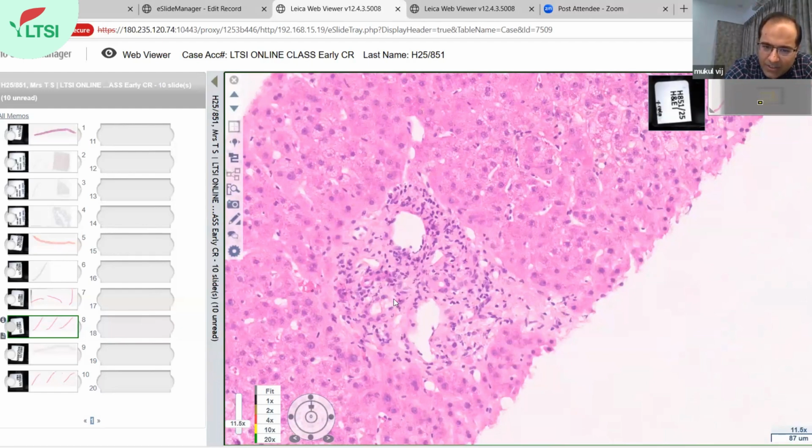This is the bile duct here, but there is definitely some injury in the biopsy. Not much inflammation. Still, you can see a nucleus loss here. This ductule, can you see there is a loss of nucleus? They are very well aligned. So there is some loss here. Also, there is some vacuolization in the cytoplasm of the bile duct. Here, there is mild inflammation, some endothelitis, and there is vacuolization here. Arterioles look okay. There is no interface.